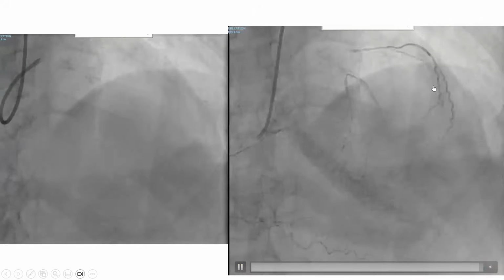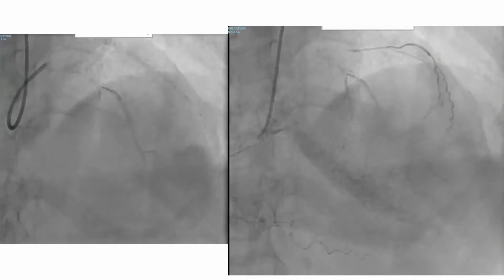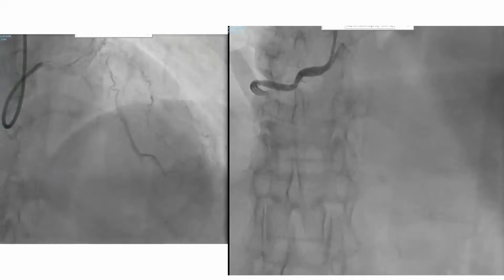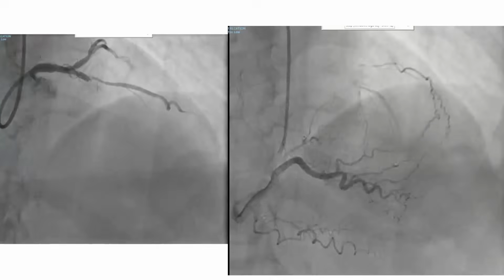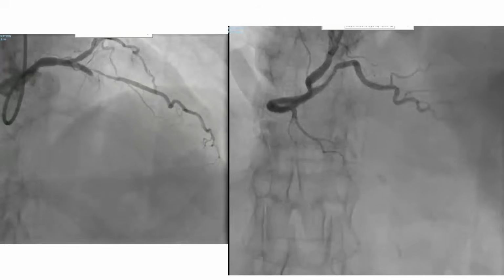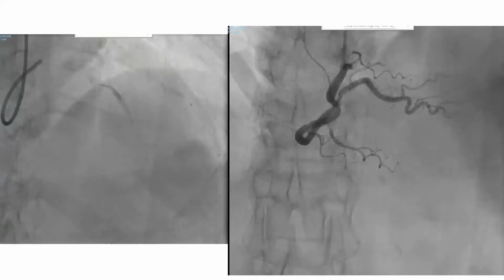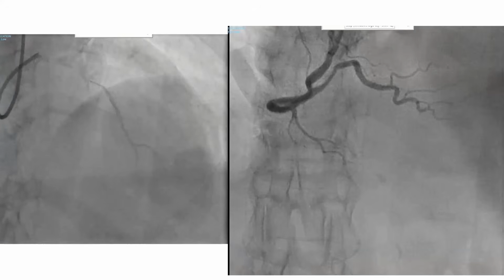And those collaterals, and the fact that it probably was chronically severely stenosed before it fully occluded, explain why ST elevation is so subtle in this patient. There is some flow to that infarcted territory. That may be why some of those subtle STEMIs are on the overlap between non-STEMI and STEMI. They have some perfusion to the infarcted territory, but they need to be cathed and recanalized emergently.